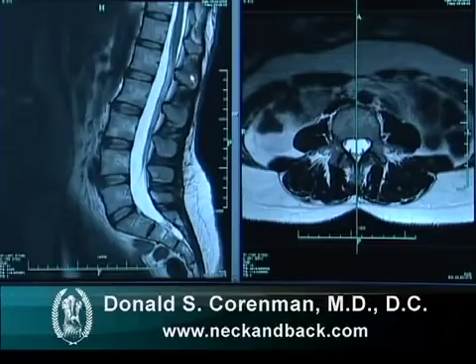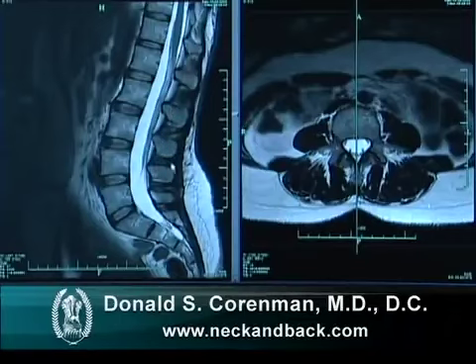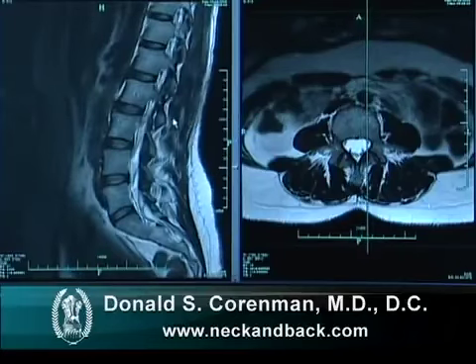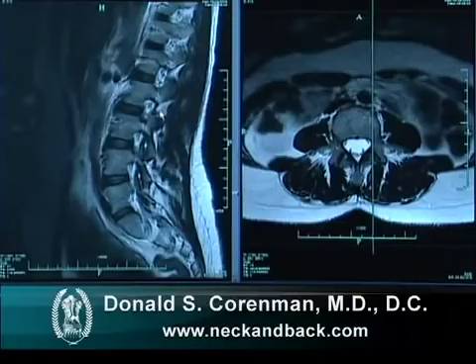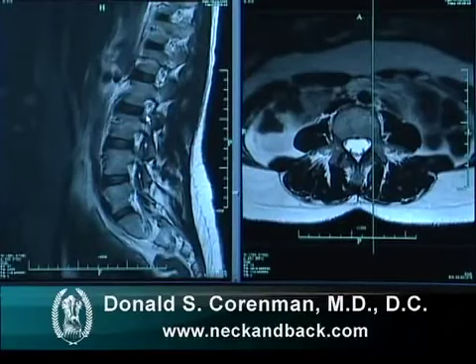If we follow back here, we can see the spinous processes of the vertebra in the very back, and in between we see both muscle and ligament that hold these vertebral processes together. We can take the side and come to the outside where the nerve holes are, and now we can visualize the bony tunnel called the foramen where the nerve exits.